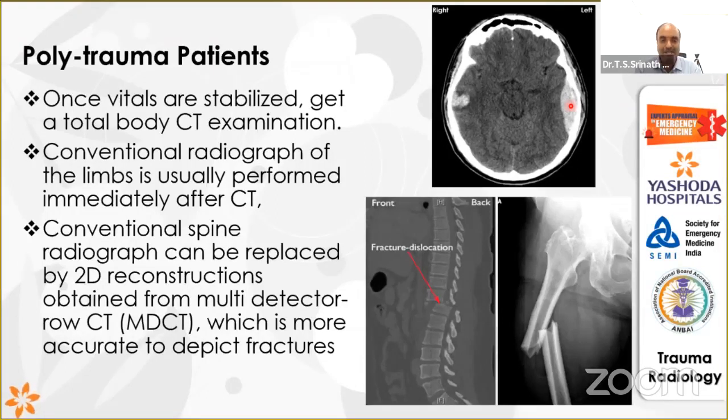So I've already explained to you, this is a classical picture. What you see on a CT brain is an extradural hemorrhage. You can see here, this is not crossing your suture lines. This is important, because again, I'm stressing, many of us lose patients in the lucid interval.